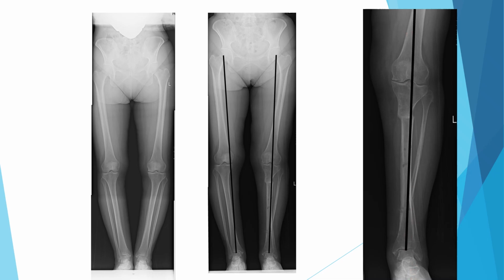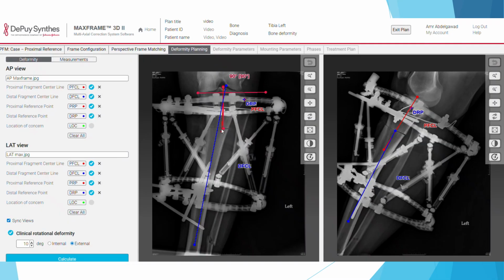So I know that we went quickly through this. This lecture is not enough to describe that. You go back to the lecture of the principles of osteotomy, and you will understand that better. But this was important because we're plugging the deformity items into the software, so you need to know which points to pick. So now let's go back.